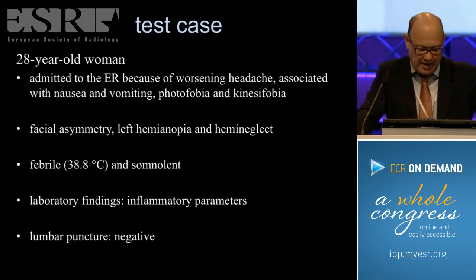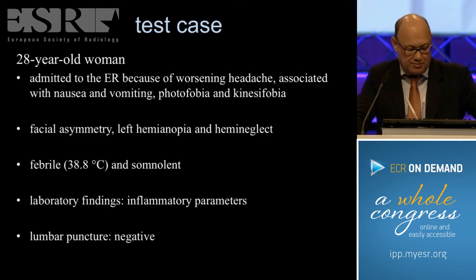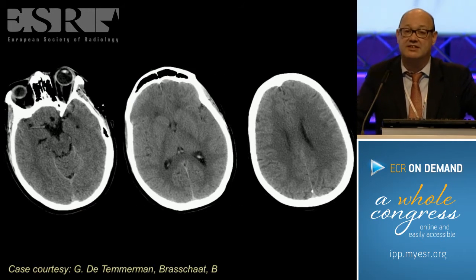It's a 28-year-old woman, and she's admitted to the emergency room because of worsening headache. She has facial asymmetry, some drooping of the face. She's a little febrile, somnolent. On the laboratory, we find some inflammatory parameters. Lumbar puncture was performed and was negative. This is the CT scan.